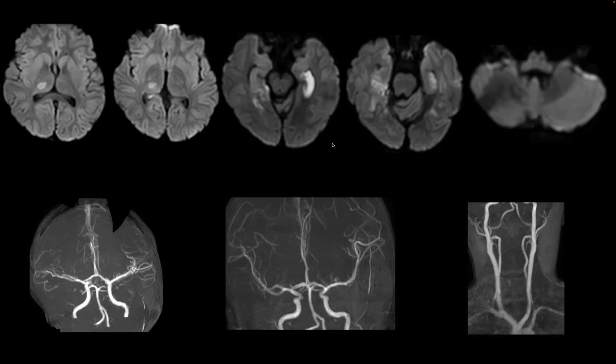So we need to know the grade of the vessel wall enhancement. Usually when you give contrast, there should be some form of enhancement. But is it causing significant narrowing of those involved structures? That would be inflammation, and thrombosis is slightly different, again, there are 2 different processes. And all this has started after that COVID thing.